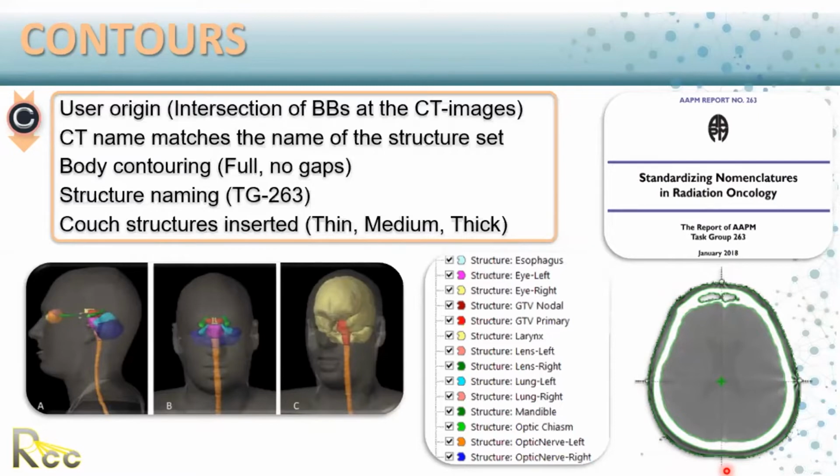This will make really a big difference for you, especially if your target is close to the surface. You have to make sure that you use only the real anatomy of that patient and not include the mask itself. And you have to create your own structures for PTVs, rings, and so on. We don't touch the physician contours. Usually as planner or dosimetrist, we create our own contours, and then we start from that to modify, play with it as we want. But the physician contours, usually we never touch.